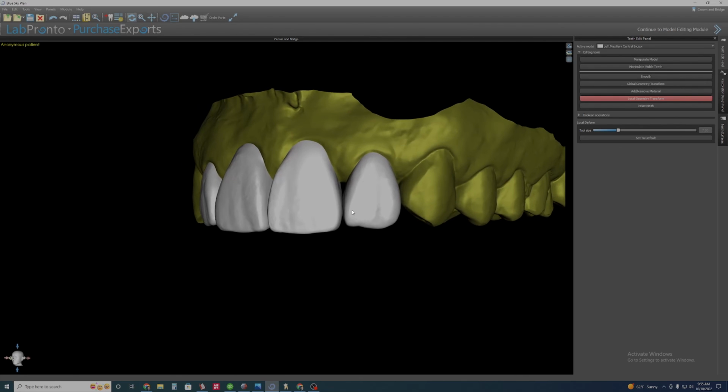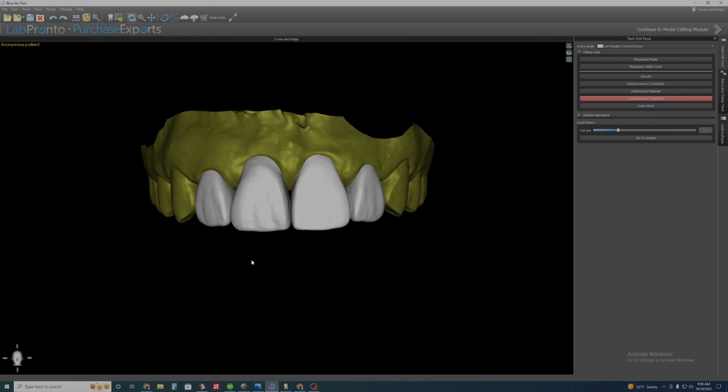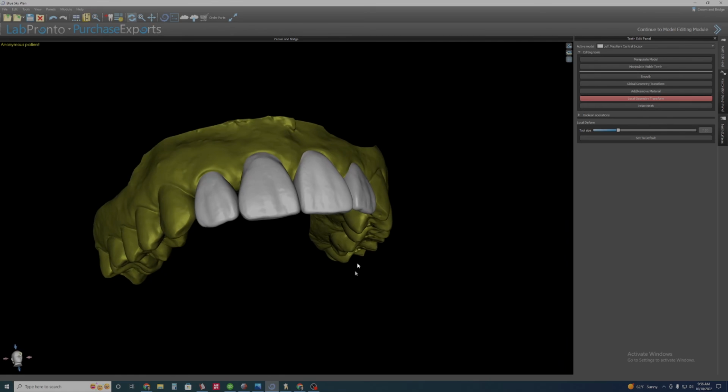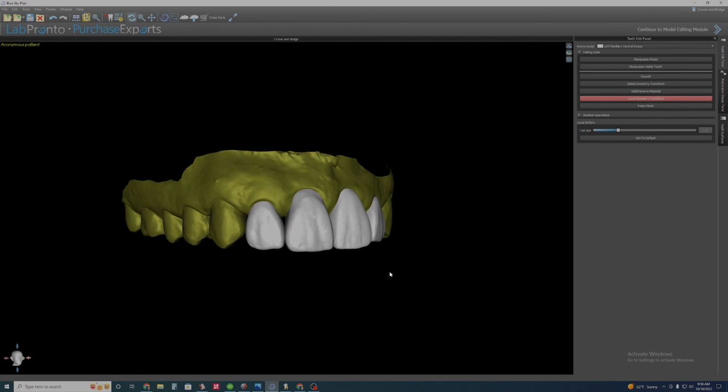more in a traditional sense, not with this little mamelon indentation on the edge. Try to get it to match the centrals just a little bit more. Even the centrals, I might flatten the incisal edges a little bit too. And then, like I've mentioned before, try to get these areas to not look so dramatically round, and make sure that I'm preserving all my contacts. So I'm going to end this video, and I will resume with the fine-tuning portion.